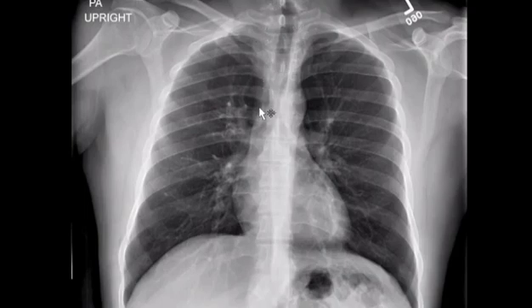What I do is I follow the right side of the mediastinal silhouette down, making sure there's no mediastinal widening. Follow this on down through my right heart border to make sure it's not obscured or silhouetted out by some consolidated opacity, like a pneumonia. Again, I come down lower along my left heart border. Really pay attention to this AP window here just below the aortic knob, because you can have nice little enlarged lymph nodes or masses that like to live in this region. Same goes for the right hilar and left hilar region as well. You can find a nice mass in there that'll bow this out subtly. Then what I do is I follow my mediastinal border on up as well.